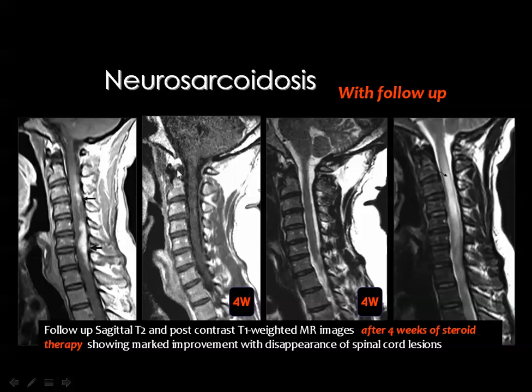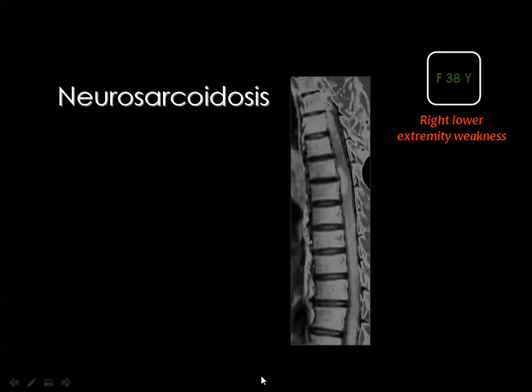And the T1 weighted image, and you see here, this is T1 post-contrast, the follow-up of this. There are big lesions that have been totally regressed, and also the diffuse intramedullary high signal intensity has also regressed. And this is one of the criteria of sarcoid showing regressive course with treatment.